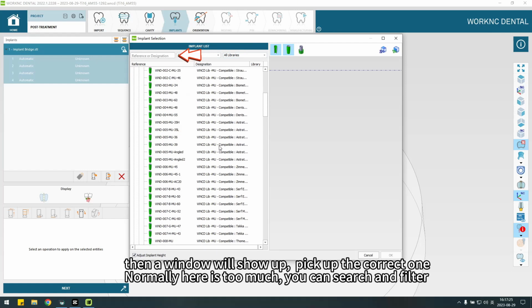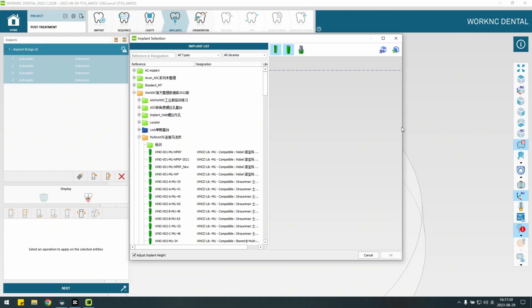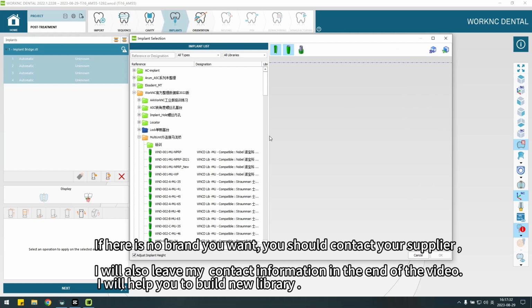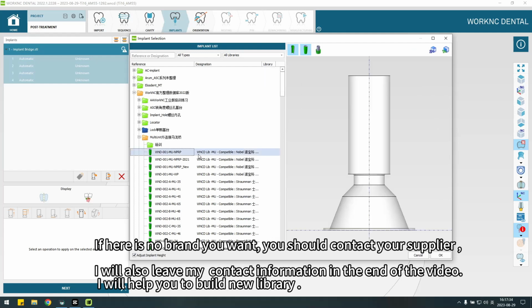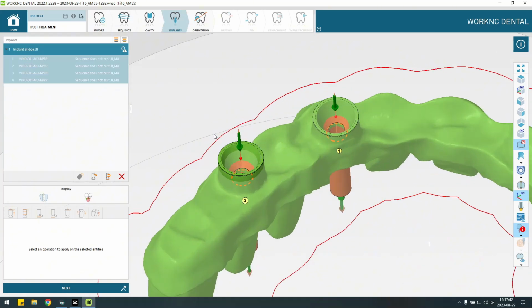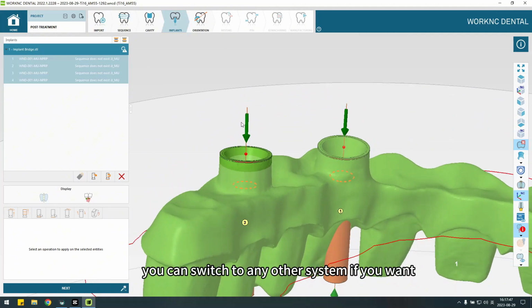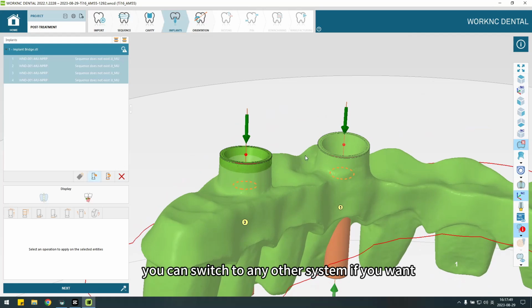Normally there are too many to choose from, so you can search and filter. If there is no brand you want, you should contact your supplier. I will also leave my contact information at the end of the video. I will help you to build a new library. You can switch to any other system if you want.